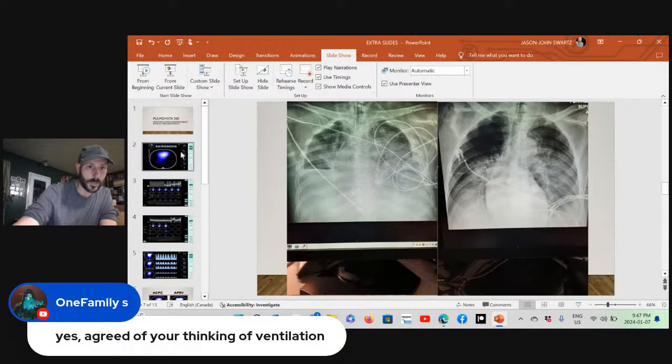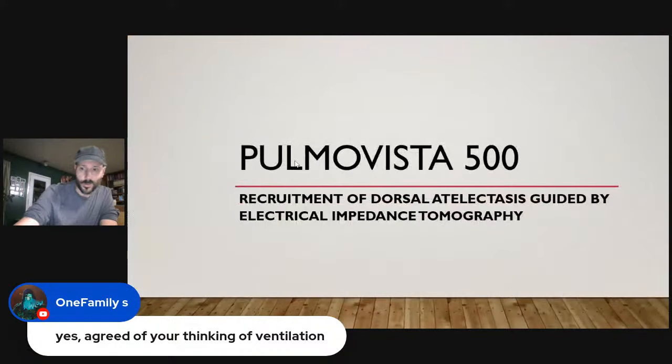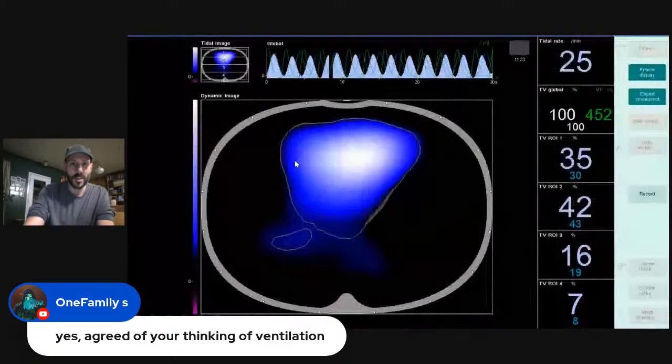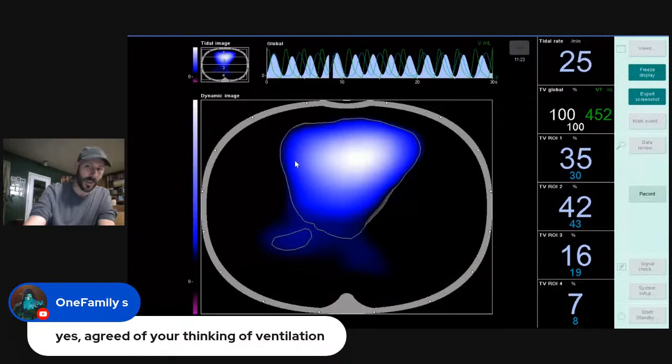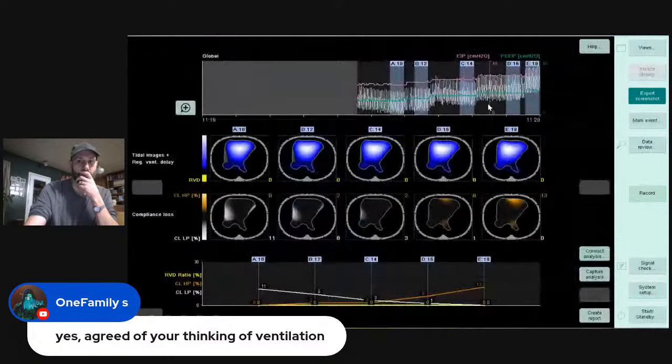Here are a few more examples I can show you. I have all sorts of random examples all over the place. I don't remember anymore what they are. Here's a horrible one too. Okay, very bad. The distribution should at least cover all this area here. So poor distribution in this one.